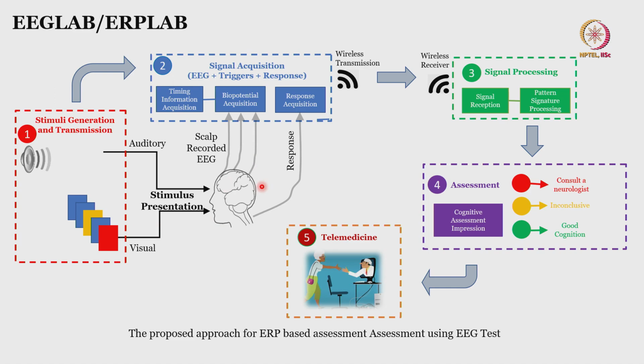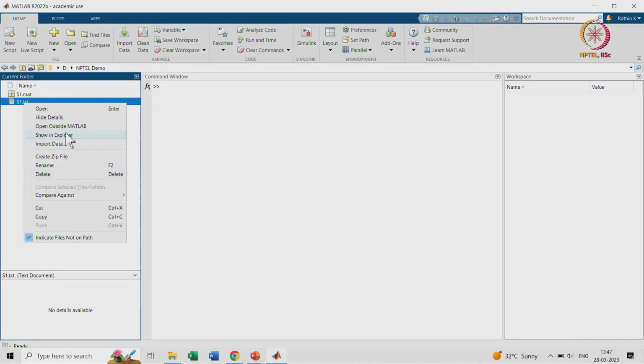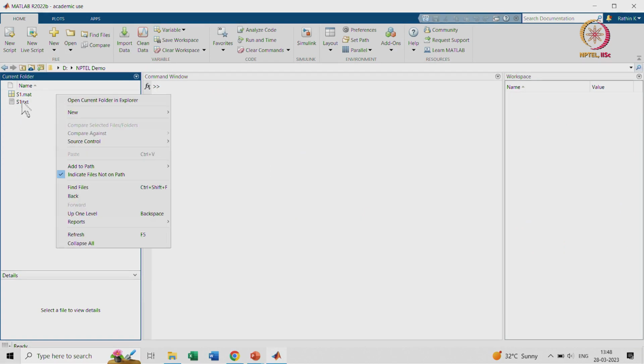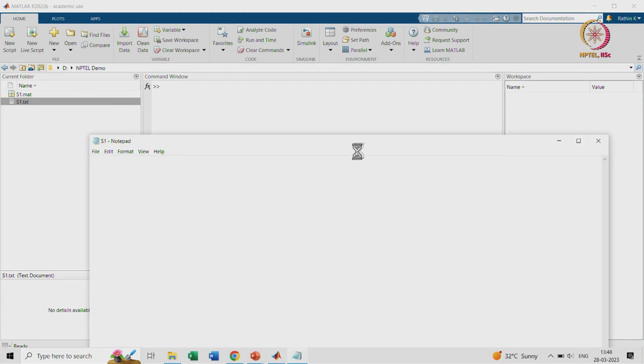So I will quickly switch to the code walkthrough. This is what the recorded file looks like. Now I will just show you what is there. This was recorded using the OpenBCI Cyton board, which has a 250 hertz sampling rate, which means that every 4 milliseconds you will get one sample. It is for one particular subject, subject 1, and it is opening. You can clearly see once it opens that it records 8 channels.